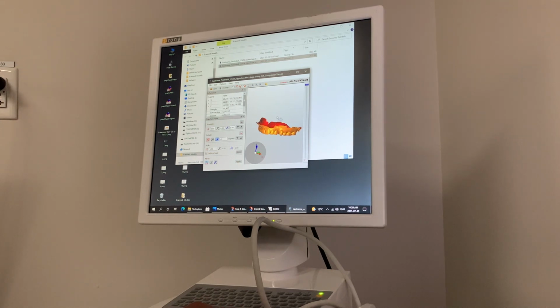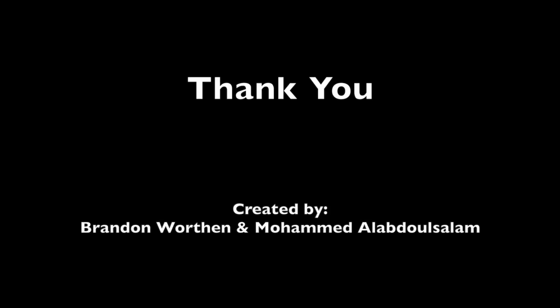It is very user-friendly and you can easily navigate and assess all the digitized casts.